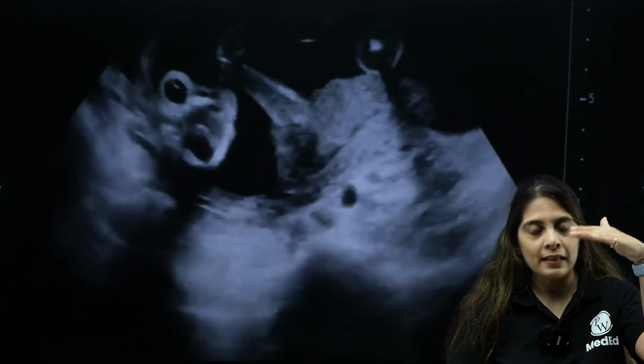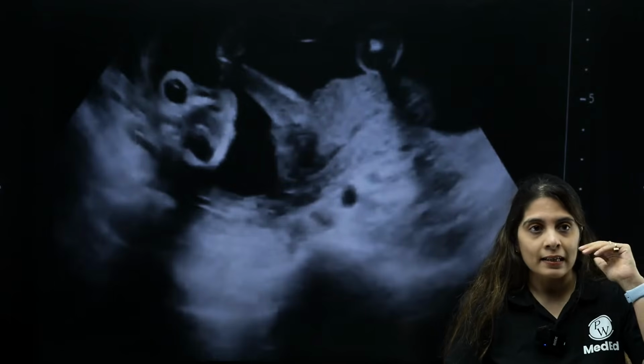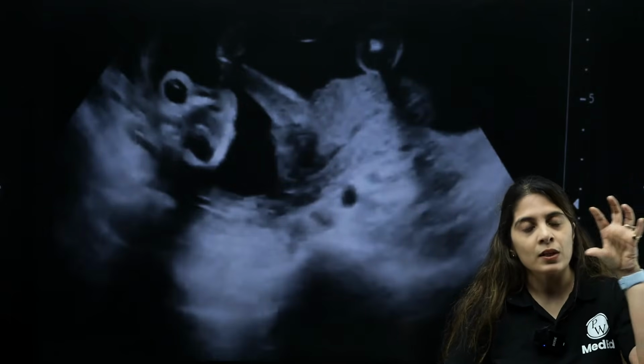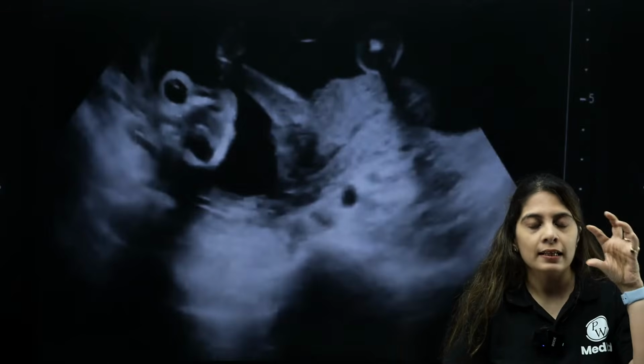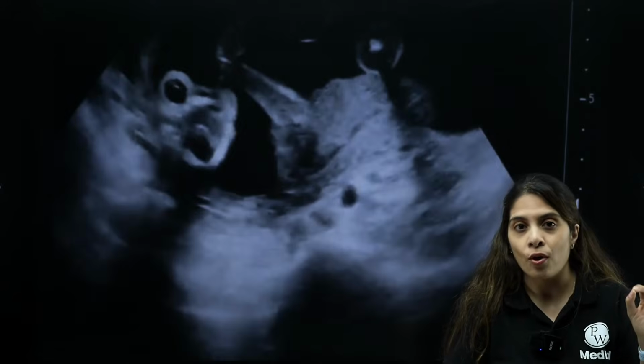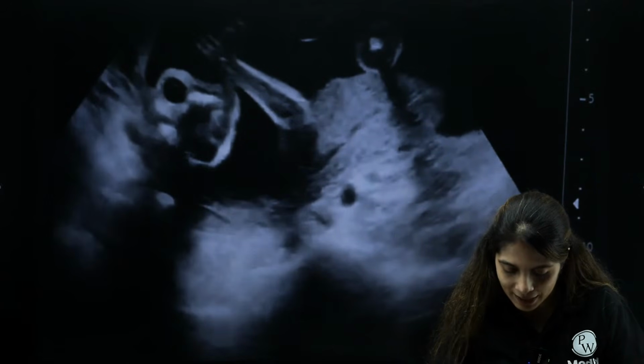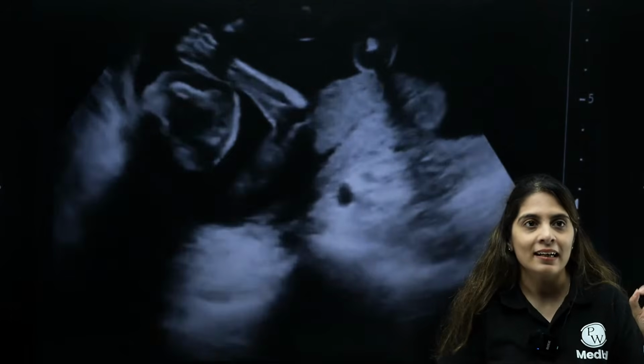What happens in anencephaly? There is absence of the calvarium just above the level of the orbits. Because the calvarium is absent, the orbits, the globes which are there, are protruding. This appearance is called the frog eye appearance that you will see in anencephaly. Yes, Puneet, Shantanu, it is the frog sign. So this is the classical history.